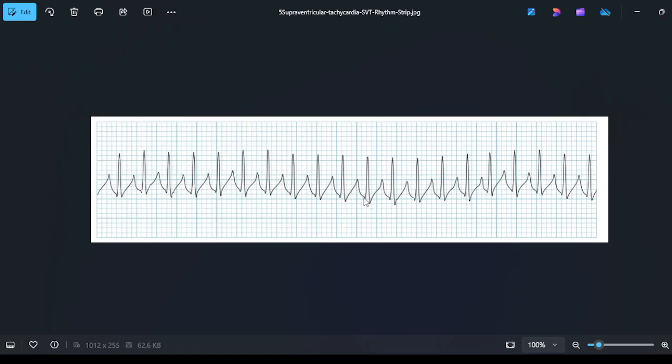There is a T wave. There's no P wave. Sorry, T wave, no P wave. Right? This is a supraventricular tachycardia. You will not be finding any P waves in supraventricular tachycardia. Whereas in sinus tachycardia, you might find P waves if the rate is slow. If the rate is very fast, then you will find a camel hump.